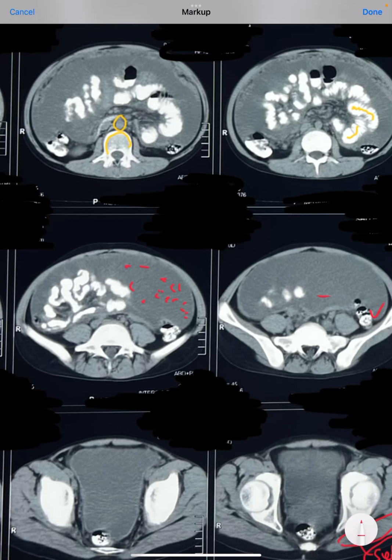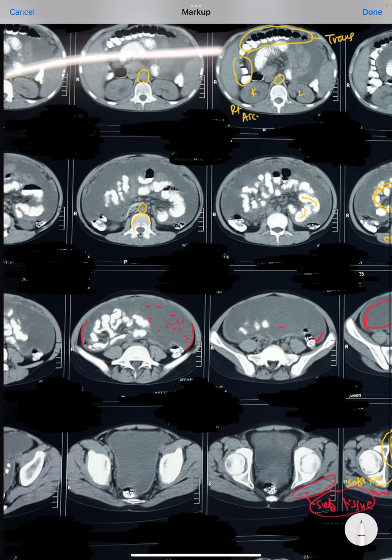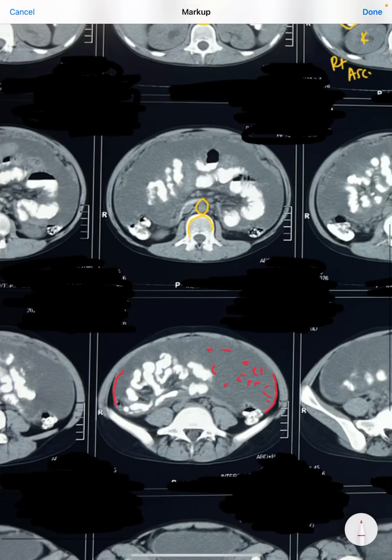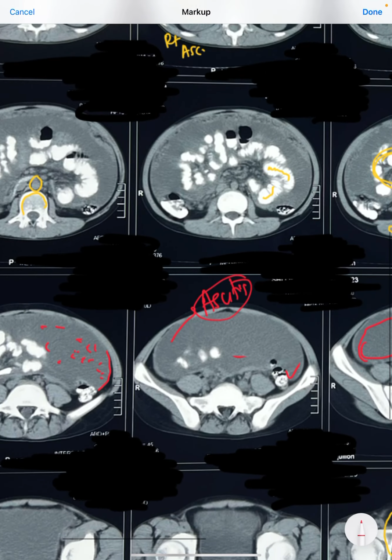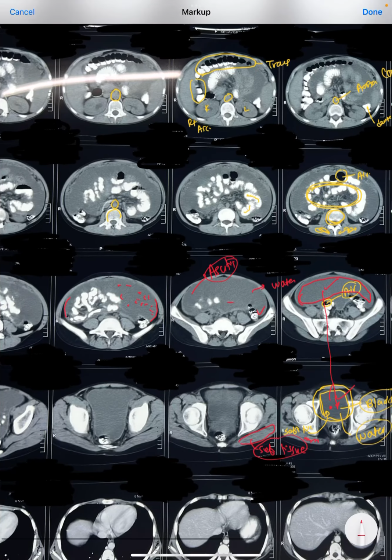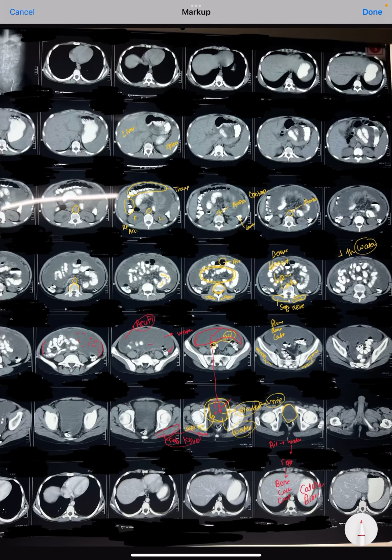And this is basically the peritoneum. This is the layer of peritoneum. And peritoneum is everywhere. Peritoneum is present around the liver, around the spleen, around the small intestine, large intestine. It is the covering of, in short, all the abdominal organs for smooth functioning. So this is all water, meaning the patient has extremely gross ascites. We can see the gross ascites here because this is the radio density of water. Now, to have ascites, we must have some inflammatory process somewhere. The patient must have some inflammation.